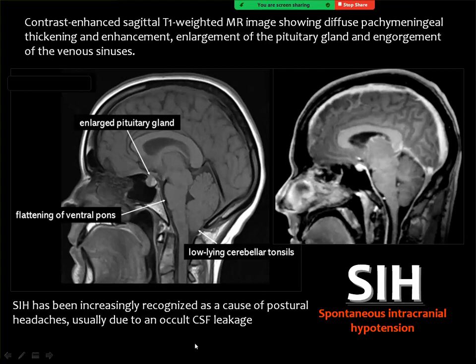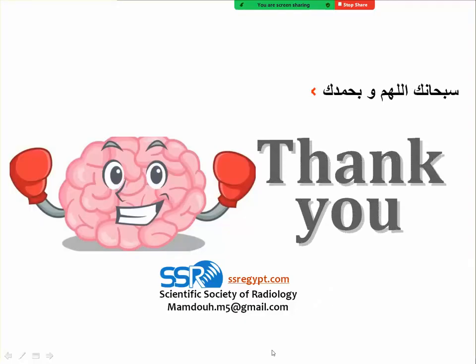These findings support the diagnosis of spontaneous intracranial hypotension with distension of the venous sinuses and the enhancement of the dura, as I have said.